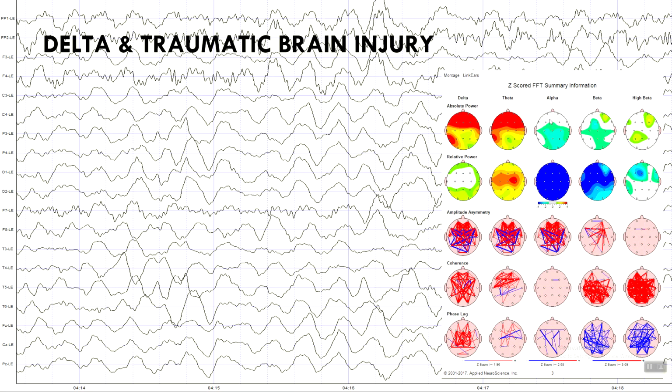And so when I'm talking about high or low delta, what I'm referencing is how many steps or standard deviations we are away from the norm. If you can see my arrow, this little scale down here at the bottom is a scale of steps or standard deviations away from the norm.